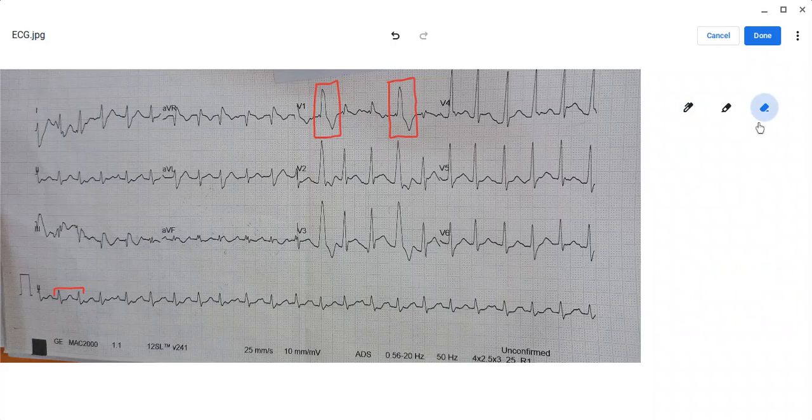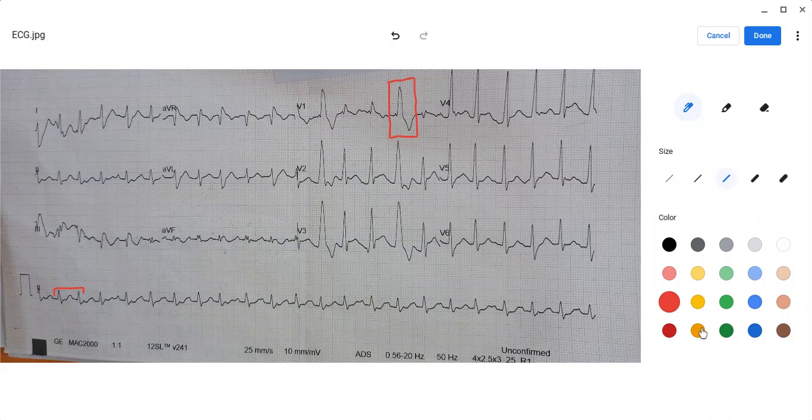And another thing which is very important to look at here is that the QRS interval is wide, very easily visible in lead 2 and all the leads. You can see it in any other lead. See here, the QRS interval is wide. And again in the anterior leads, the classical pattern of right bundle branch block is visible here. The RSR pattern: the small r, then small s, then a big R. RSR pattern also visible here. This is the classical pattern of right bundle branch block, the RSR pattern.